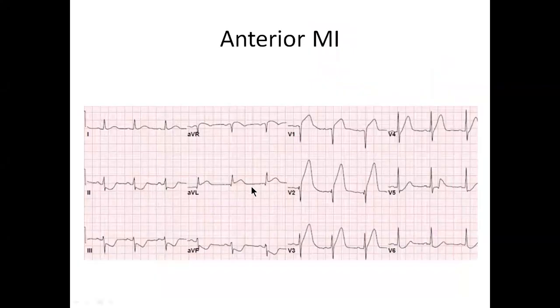Now this is a real ECG. Again, please, you have to go through the sequence when you are looking at an ECG. Don't jump to the thing that looks abnormal. But just now, I'm just going to show what is abnormal. So if you look here, this is our baseline, and the ST should have been here, but it's not, it's up. So therefore, we call it ST elevation.